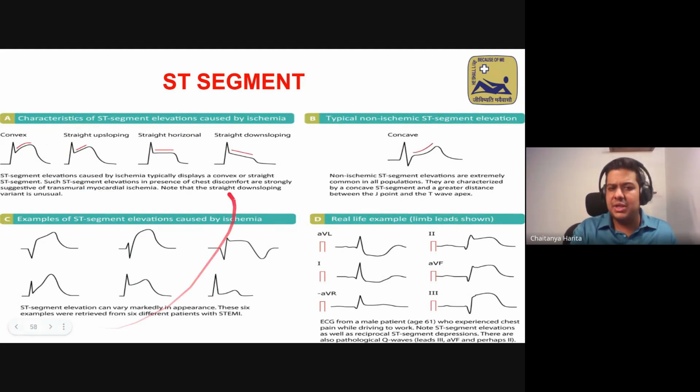And this is how they will actually look when you look at an ECG. So this is ST elevation, convex upwards, horizontal, this is upsloping, and this is mild ST elevation. All 6 ECGs are evidence of ST elevation MI. So please remember, ST elevation MI doesn't always need to look classical. It can be as subtle as this, it can be as obvious as this. It's important to know. But can you get ST elevation in a condition which is not MI?